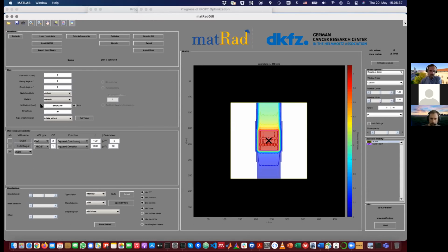And now we have optimized the carbon ion treatment plan biologically. So now we see the RBE weighted dose again, which is in Gray. And of course, you also see the dose tail. We can also move back to, for instance, the physical dose, and we should see a similar behavior: a high physical dose at the proximal part and then it falls off. And yes, indeed, this is the case. As I've said before, because the carbon ions fragment into lighter ions, we have this dose tail.